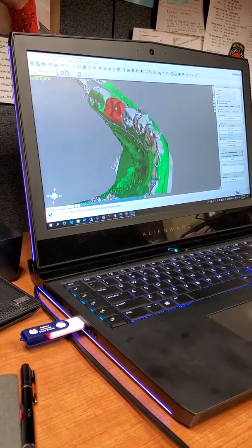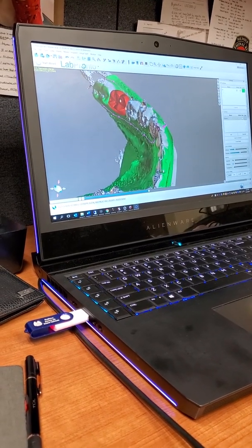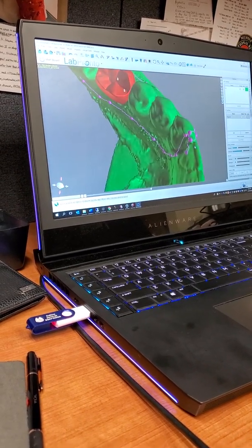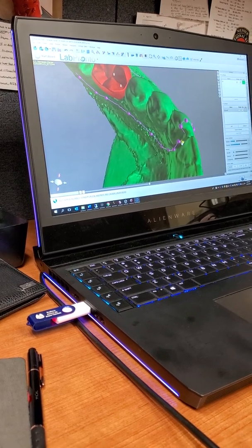So there's a point that's hidden somewhere. So I can go to surfaces and turn off the original CT. Now you can see much better where all these little pieces are and parts. So I can kind of tell this goes over here, this goes over here.